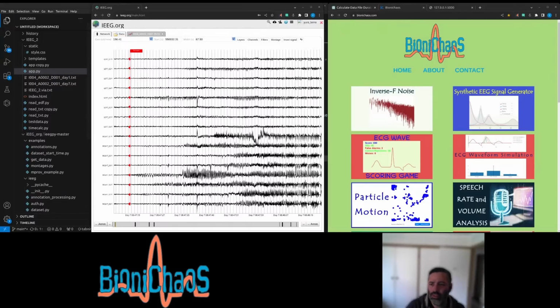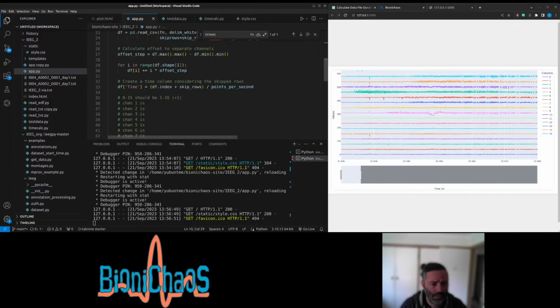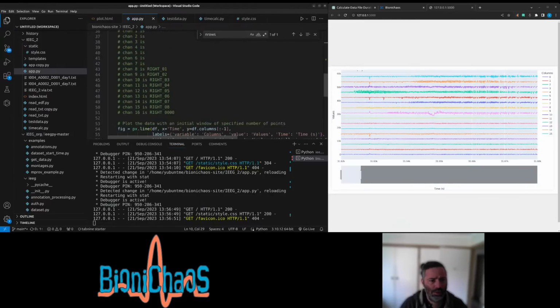I'll pop this in the chat. This tool is not available yet, but should be available shortly. Once we finish this update, we'll probably publish it on the website. The link is in the chat. I'm just trying to sort out if channel 8 is right or 1.